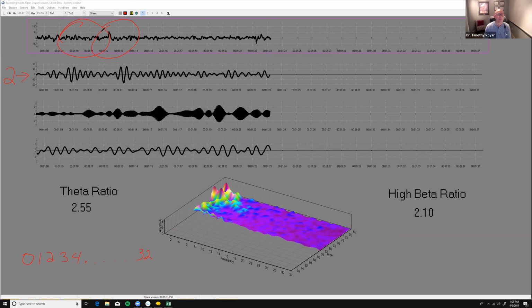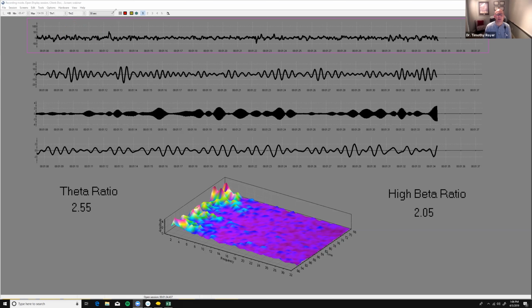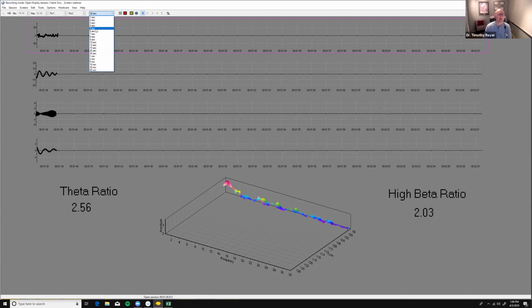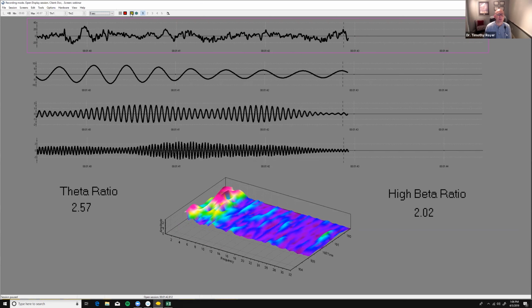So I'm going to speed it up for a second so that we can look at it in an actual second and see how it cycles, okay? You're looking at it over about 30 seconds, but let's look at it first at 5 seconds, okay? And I'm going to pause it for a second, okay? So we've talked about this, but let's annotate this, okay?